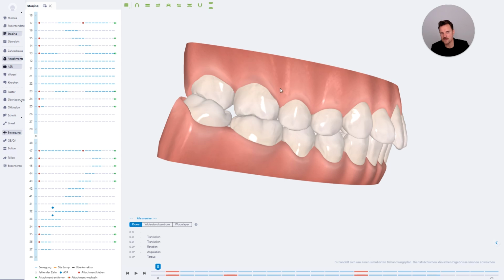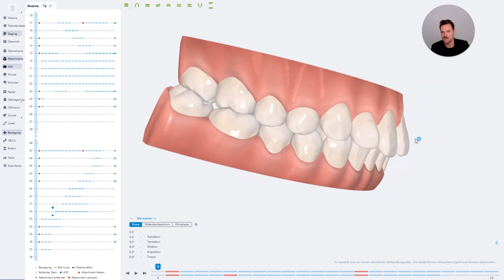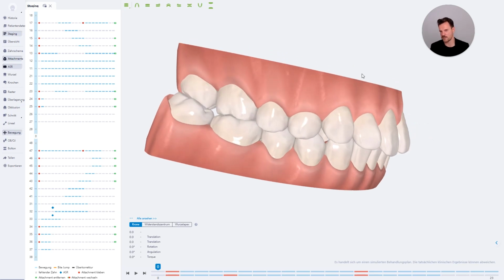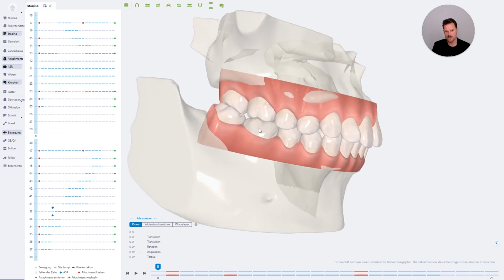And you can also change this trim line by communication in these cases. You can explain to the technician you would like to change the trim line from stage 25 to 38, and you can individualize the trim line. And again, this is also very interesting software because we can have a look at the bone, at everything, and you can show it in a different way.